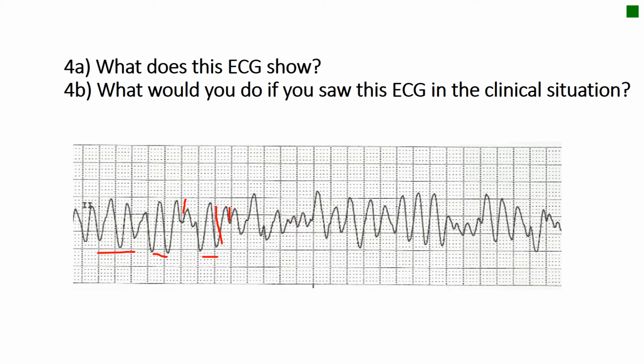So what would you do in this situation if you saw this ECG? Well, this is a shockable rhythm. You'd expect no pulse in this patient, and you want to get an automatic external defibrillator to the patient and shock them as soon as you can.